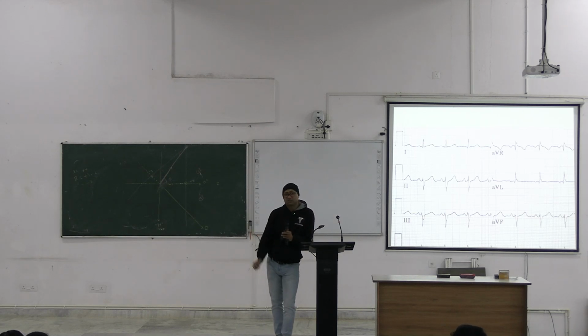And it is left axis deviation. Okay. It is left axis deviation, most probably in a case of left ventricular hypertrophy, or it may be a case of left anterior hemiblock. Okay. We have not studied block yet, we will start block, heart block. Okay. Clear?